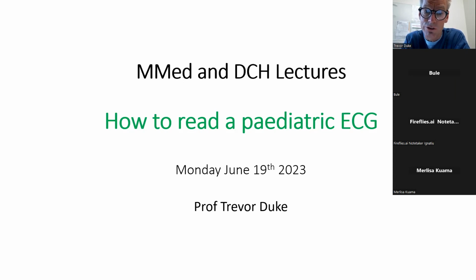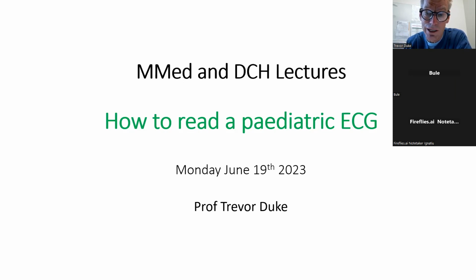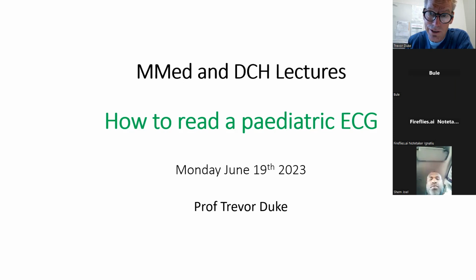I think it's good to have a system to read paediatric ECGs because once you know the system, it's actually quite easy to do. So I hope this simple system that I'm going to teach you today will be familiar to you, much of it will be, but also an easy way that you can learn how to read a paediatric ECG.